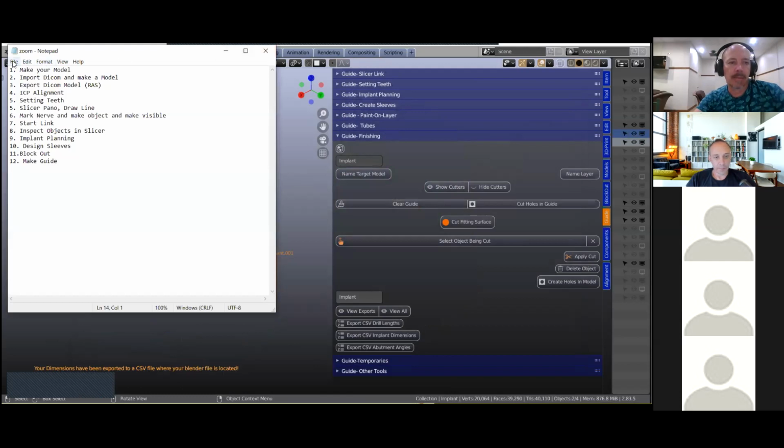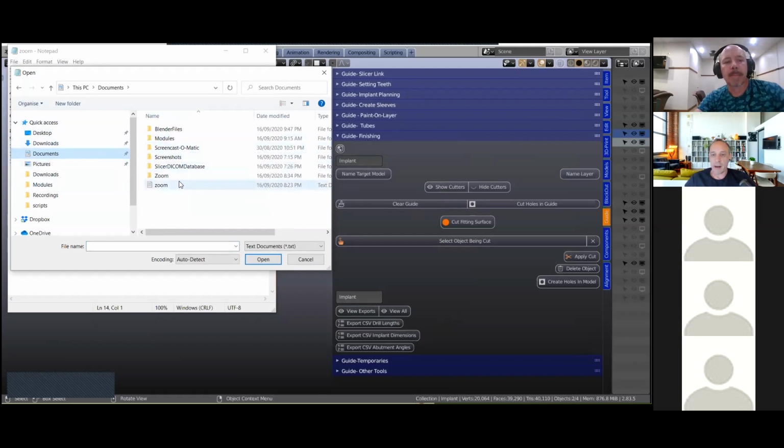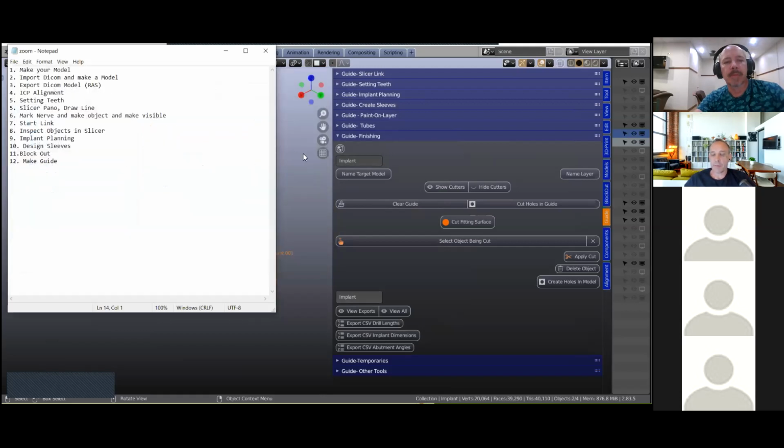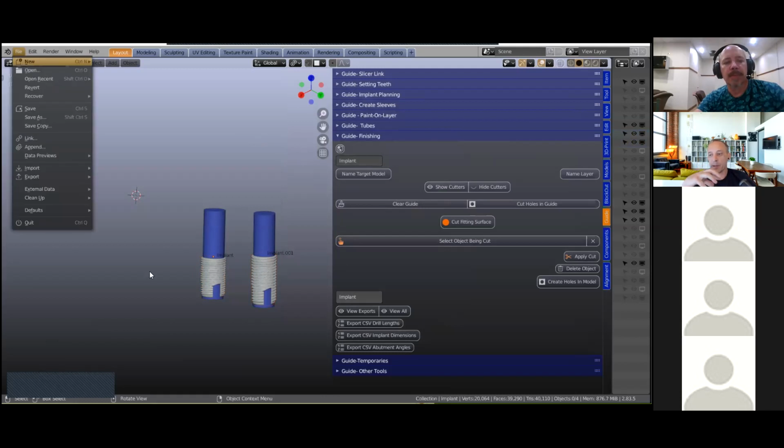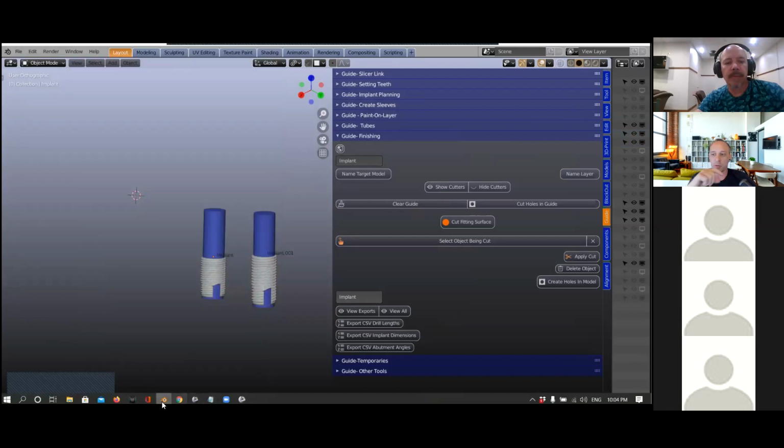Sorry. Okay. Wolfgang, maybe you can just take over for a second for any questions or whatever. Yeah, I'm just open for checking the chat messages. There was one question, or actually, it's a great idea to extend your skeleton frame to go in between the guide sleeves as well for extra support. You can just cross bar any way you like.